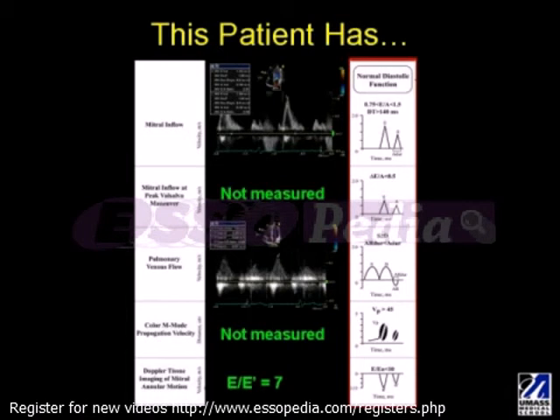So in this case, looking at the weighted information, just looking at the mitral inflow and the tissue Doppler and the pulmonary veins, we know that this patient does not have elevated filling pressures.